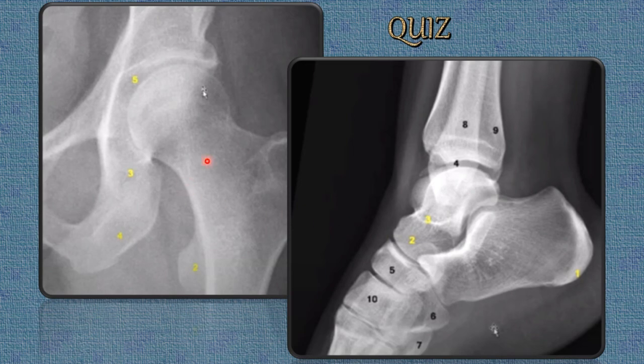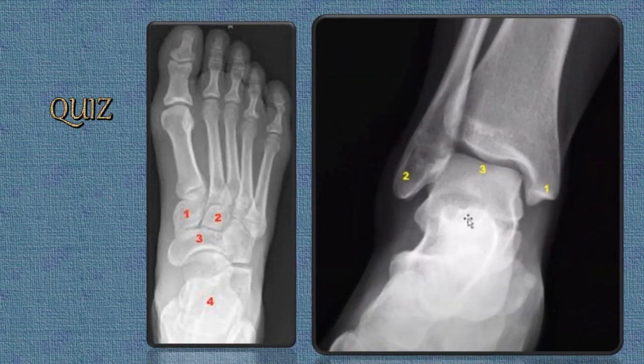So we have learned everything. So I'm sure you must be able to answer these. Again, what is this? What is this? What is this? So easy. 1, 2, 3, 4. So easy.